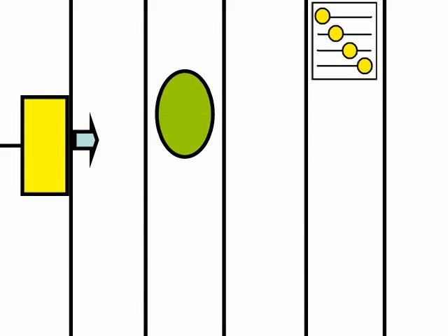One pulse was produced, one echo, but the pulse changed direction when it met a structure with a different propagation speed. Echoes are produced, but they are not from the center of the beam, they are echoes from other areas, and the machine cannot understand this.